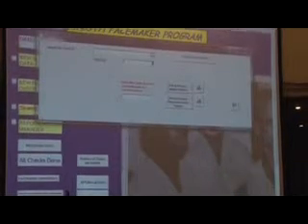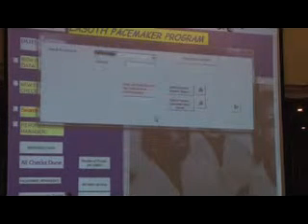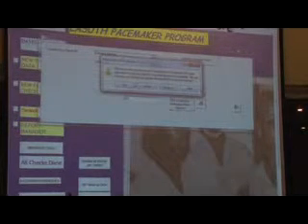We can also produce reports which go with the patients. So say I pick up a patient here, I put the patient's number in, 252. I can then see that patient's, I don't have a printer here. Just click OK, that's fine. And you can see here, it generates a report automatically, which tells you the implant reports, everything, the lead analysis. So all the information that you need is in there.